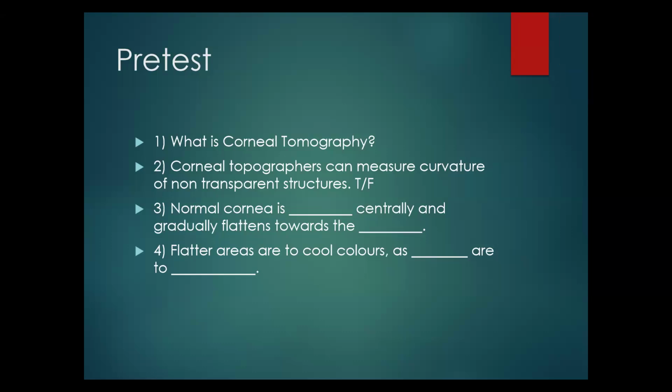As red and orange are hot colors representing steep areas. Okay, no, no, I only wanted... Wait, but red and orange, are they not hot? Do they not represent steep colors? Wait. Okay, hold on, sir. Can I come in now? No, but did you get what I mentioned? Of course, I do. Good. I do. Right. Okay. Yeah.